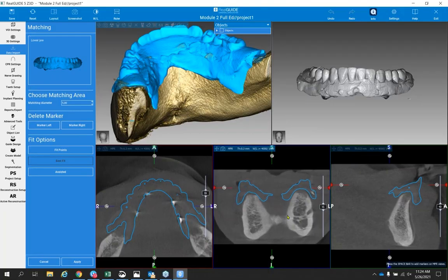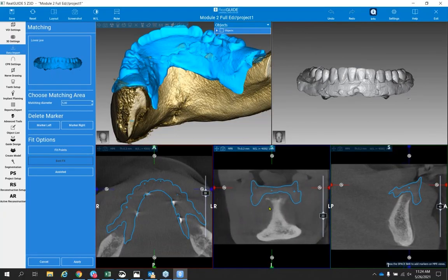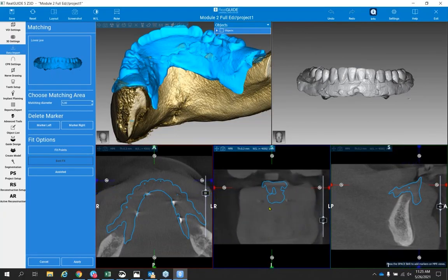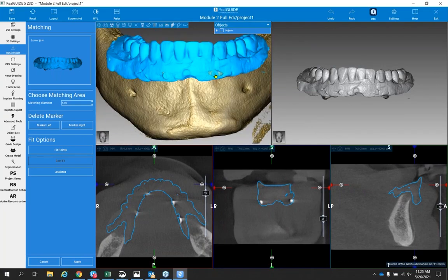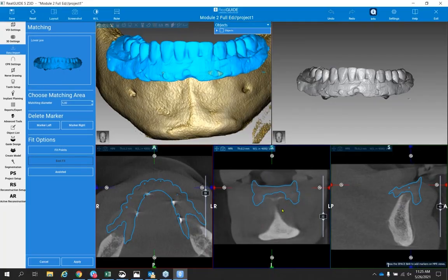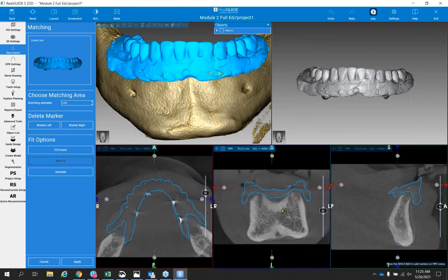We can also scan it by, if you watch on the axial plane on the far left box on the bottom, as I scroll down and up with my mouse wheel, I'm basically taking my coronal plane, and I can go up to the interior of my denture, right? And there's those 2 markers, and we can just flip this around to show you those 2 in the front, right here and here. So we're seeing these markers here, and I'm just going to scroll with my mouse wheel and just watch my denture.